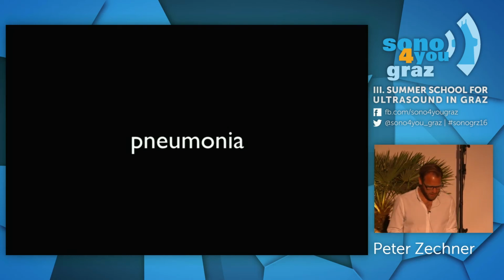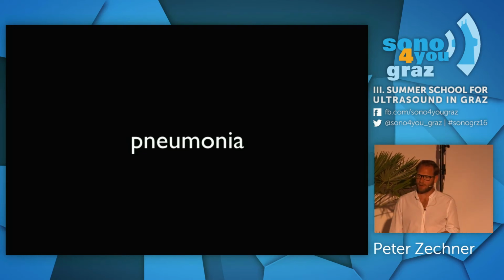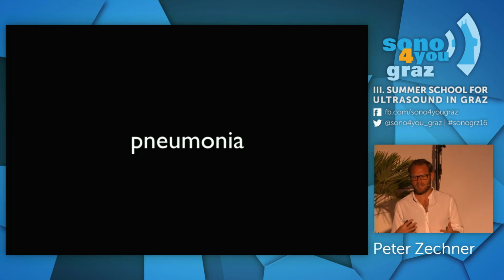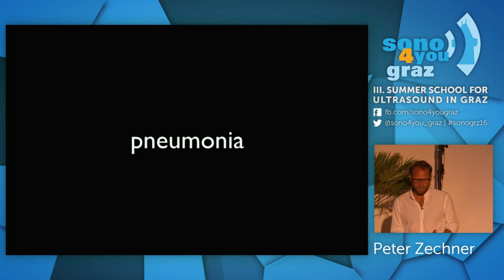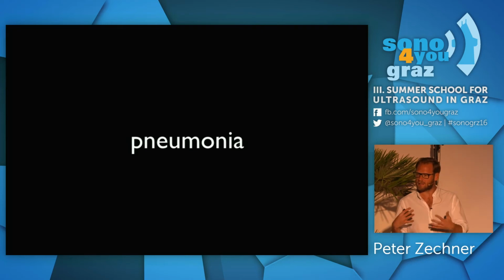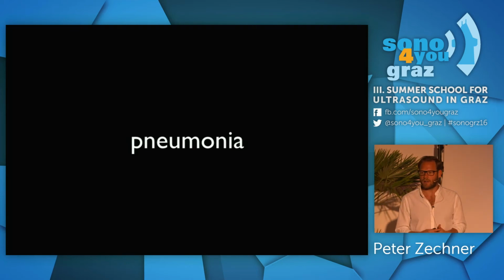I think it's not too important to count the amount of pleural effusion because that's normally very difficult. And ultrasound is not the best way to really estimate the amount of effusion, but it doesn't matter because an intervention always needs symptoms of the patient. So if the patient is symptomatic, we sometimes have to intervene in smaller effusions, and other patients are adapted very well to big effusions and do not need any invasive procedure.